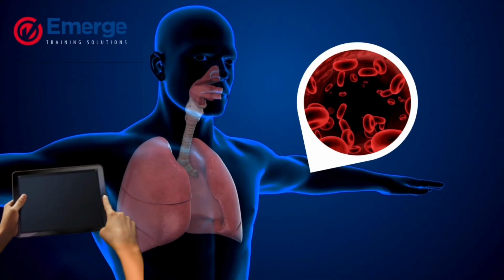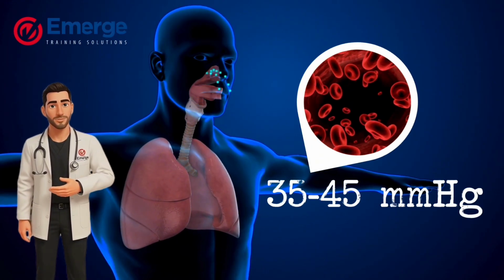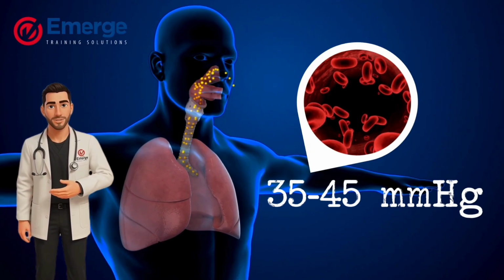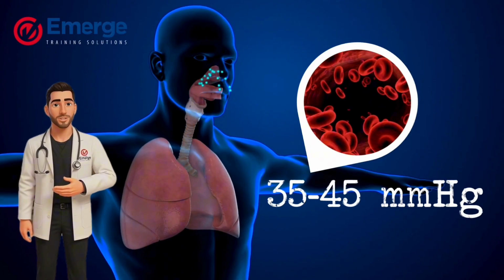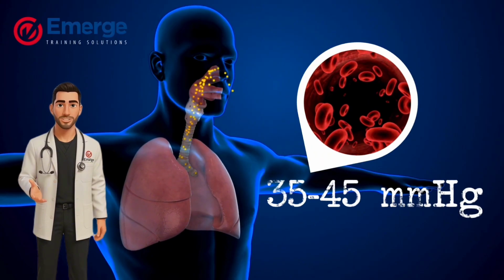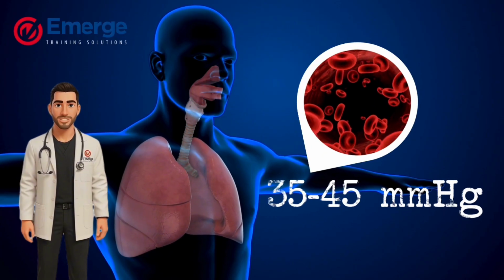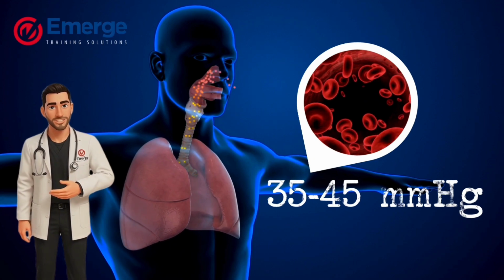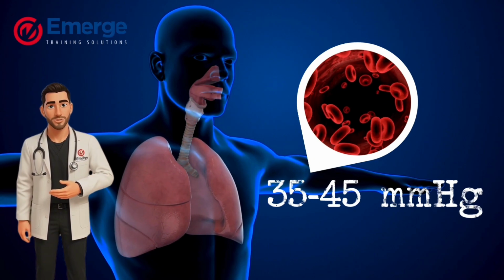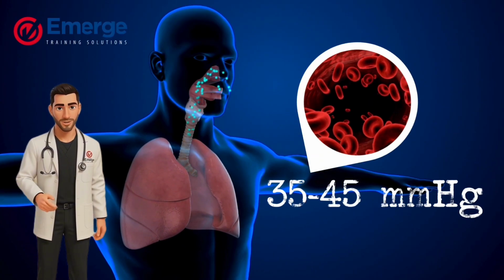A normal end-tidal CO2 measured by capnography is 35 to 45 millimeters of mercury, and a normal carbon dioxide level in the blood is the same, 35 to 45 millimeters of mercury. Under normal physiology, these two values are very closely related, but not identical. The end-tidal CO2 that you see on your monitor usually falls just a touch lower than what is actually going on in your patient's blood, about 2 to 5 millimeters of mercury lower. But still, these values are pretty close.